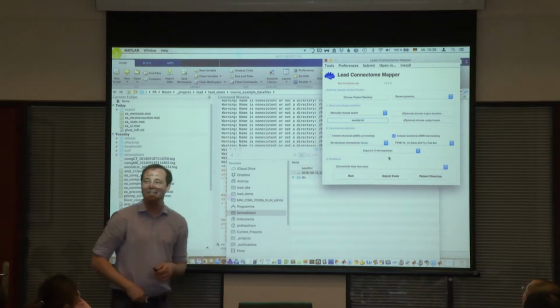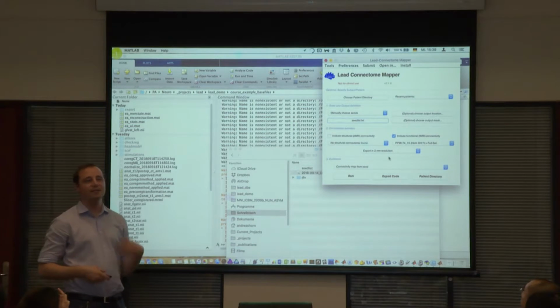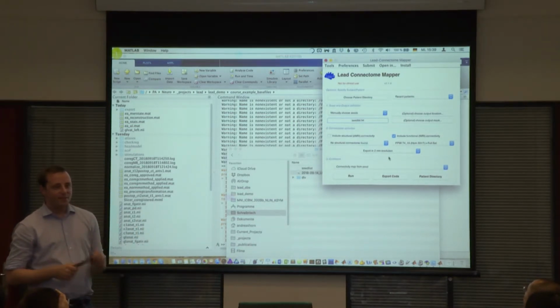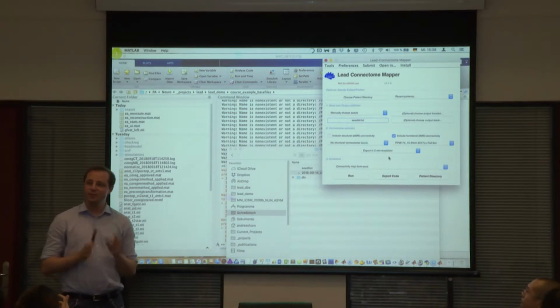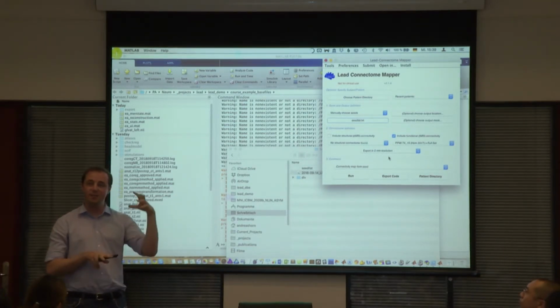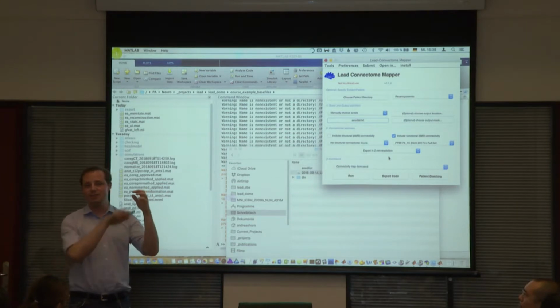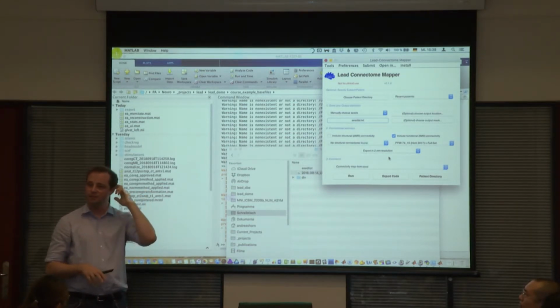Did everybody understand that? It's not complicated, but we can either select multiple NIfTI files or we can select a text file. Now, sometimes we're not really interested in VTA's connectivity, but maybe we want to know just connectivity between, let's say, the VTAs, but also the SMA. And we don't want to map, but we want connectivity strength between these.